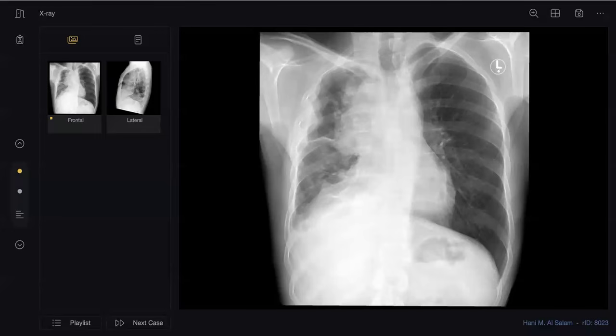What makes you think this is an anterior mediastinal mass? Because my topmost differential is that it's most likely a pleural-based mass, but it may also be an anterior mediastinal mass, which I have kept as my second differential. So this mediastinal mass that you're looking at, why do you think it is anterior?